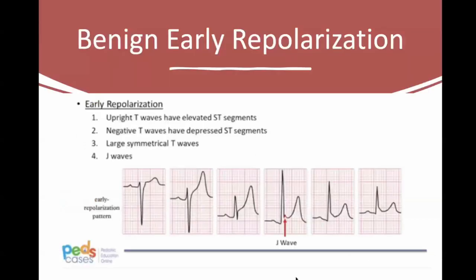The ST segment is the phase after ventricular depolarization and before repolarization. In a healthy adult ECG, this segment should return to baseline before the T wave starts. In the pediatric ECG, however, a slight elevation or depression of 1 millimeter in the limb leads and up to 2 millimeters in the precordial leads is common and within normal limits.